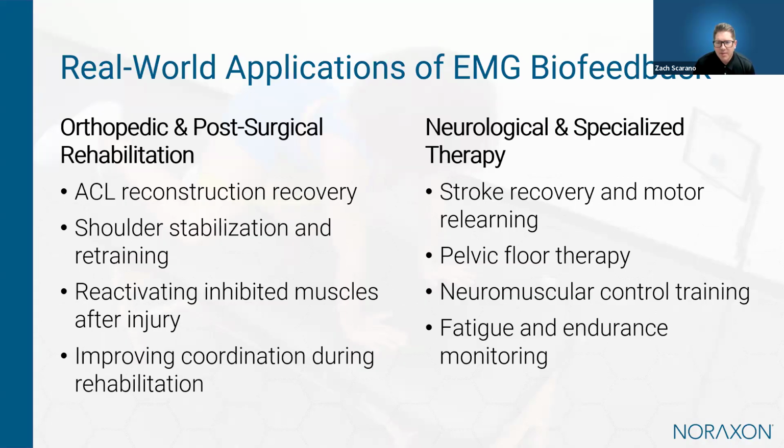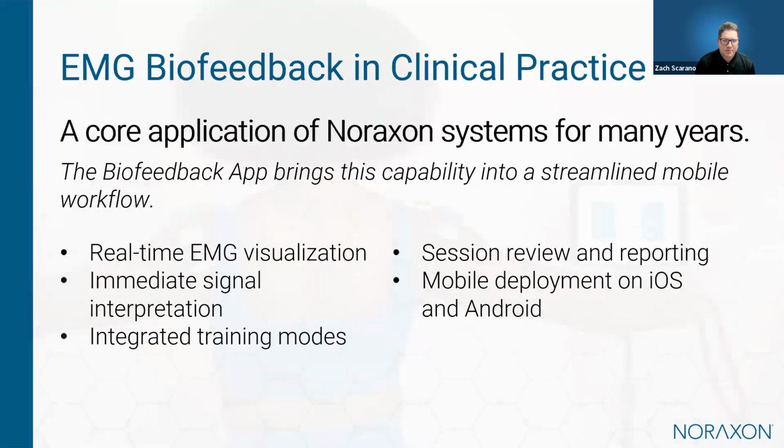In neurological rehab, biofeedback can support motor relearning after stroke, where patients need to rebuild voluntary control of muscle activation. Another important area is pelvic floor therapy, where EMG sensors can help patients learn how to correctly activate and relax muscles that are otherwise difficult to perceive directly. And so across these scenarios, EMG biofeedback helps clinicians turn muscle activation into something that's visible, measurable, and of course, trainable.